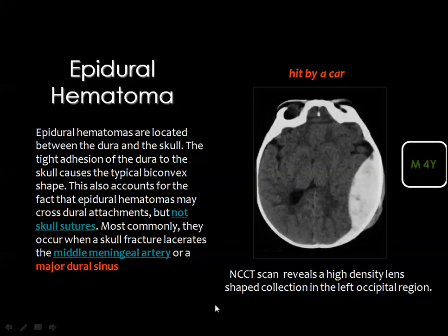And this is an epidural hematoma in a child hit by a car. And you see the typical appearance. There is a convex inner margin, and it is intimately related to the inner skull table, and is associated with a minor degree of subgaleal hematoma.